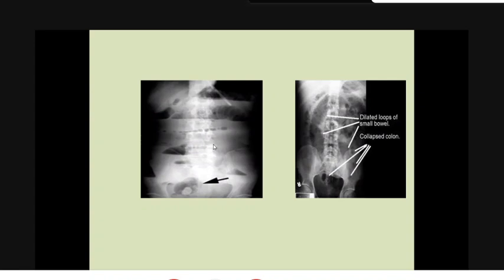We said that usually in small intestinal obstruction, there is accumulation of gas and fluid within the bowel loop. But in cases where the dilated small bowel loops are almost completely filled with the fluid, small bubbles of gas may be trapped in rows between the valvulae conniventes on horizontal X-ray films. This is known as the string of beads sign. This sign, if present, is virtually diagnostic of small bowel obstruction and does not occur in normal people.